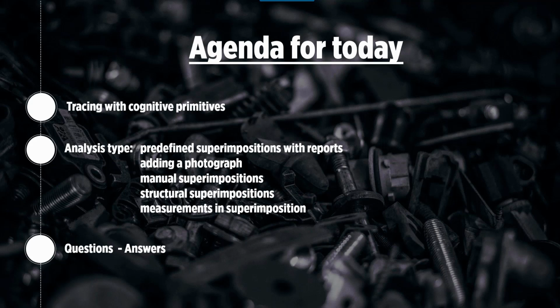I'm not an expert, so do not be harsh with me if some points are not aligned to their structures as they should be. We will continue to automatic superimposition with automatically generated reports. A nice example will also be shown with Ricketts analysis, which you may be familiar with because it's very well described in the literature.